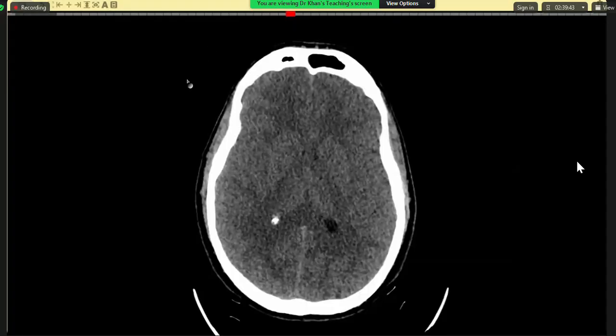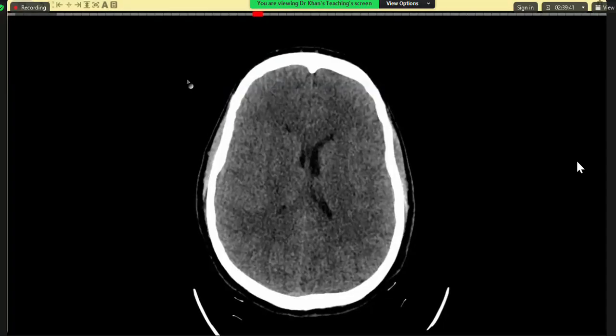Okay, candidate one. Yes, sir. This is a case from A&E. This is a 35-year-old male, severe headache and vomiting, unwell patient. Sir, should I request for contrast? Yes, please. Sir, I have. The control is with you. Okay, sir.